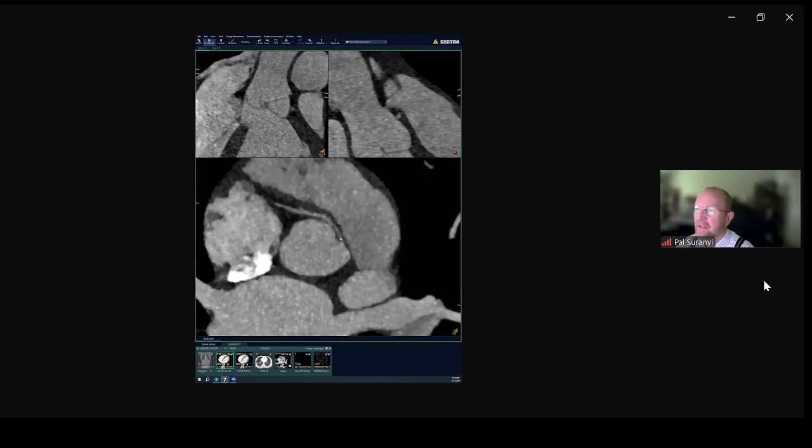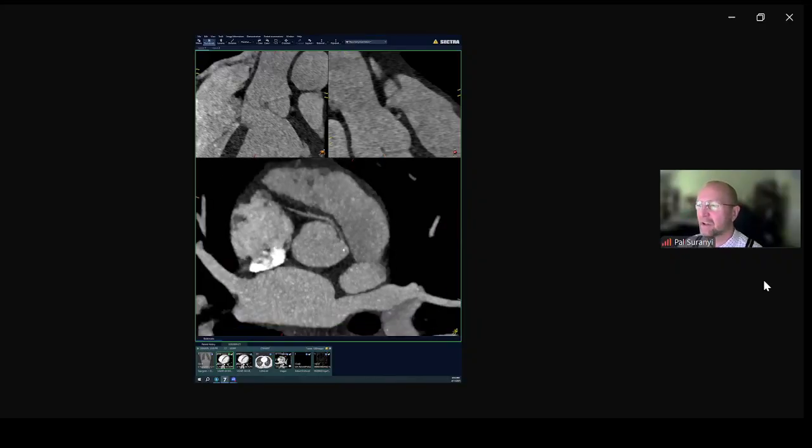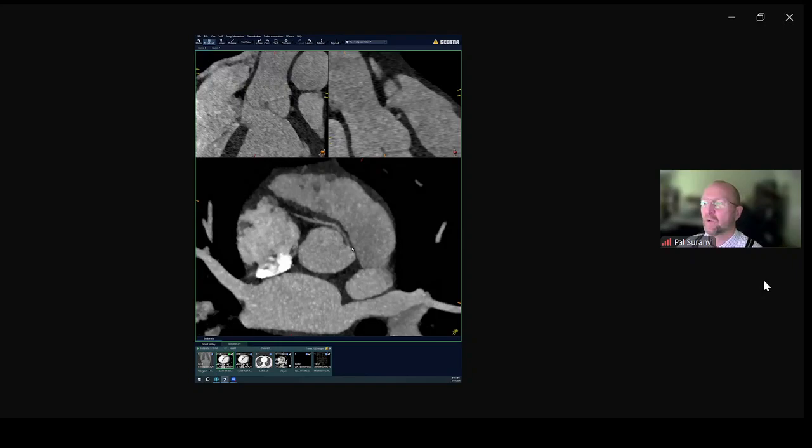So it's a little bit less traumatic to the system, and that's called unroofing, that they can do in patients like this, and sort of cure the problem at its origin without really needing to move the coronary artery or put in a bypass graft. So this is intramural and interarterial coronary origin.